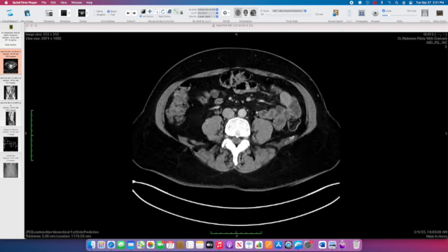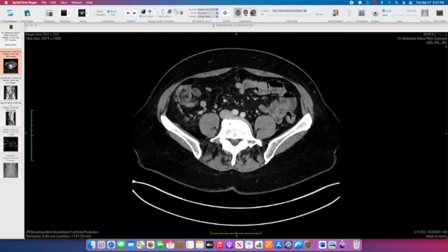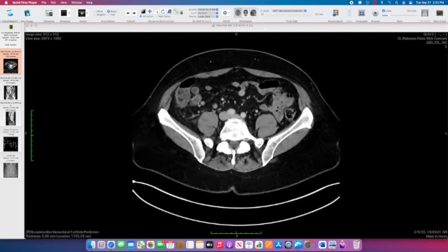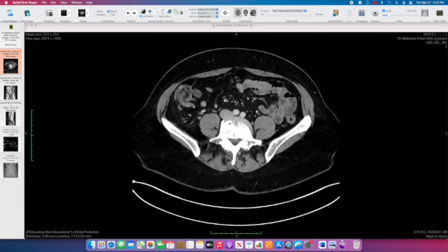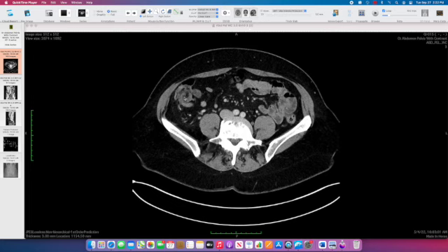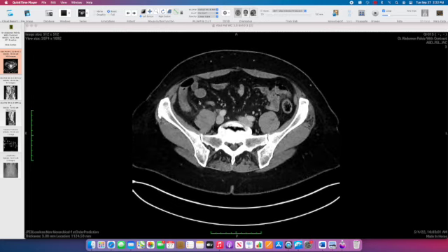No retroperitoneal lymphadenopathy, so we're now down in the right lower quadrant where the patient's hurting. Do see a mildly enlarged lymph node right there, catches my eye. And so the next thing I want to do is find the appendix. This is the terminal ileum. I can tell that's going into the cecum. I can tell that it's the terminal ileum because there's a little bit of fat in the ileocecal valve. And if I follow that out, that's clearly small bowel.